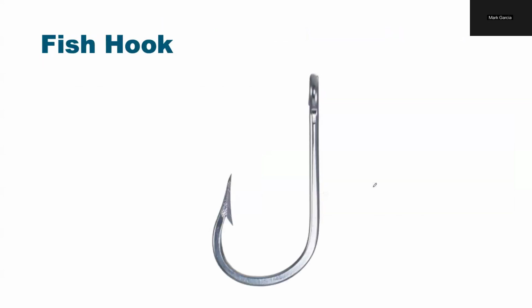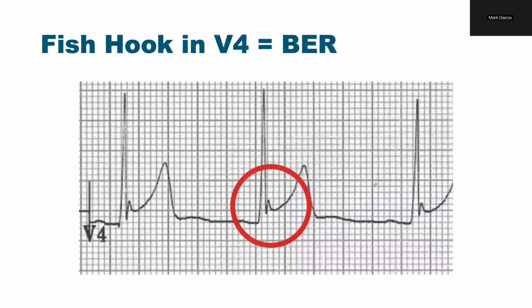All right. The other thing to look for is the fishhook, which we've talked about already in terms of the smiley face. So if you look specifically at V4, again, you see the notch and the smiley face kind of picture. And people say, oh, that looks like a fishhook. So if you look at V4, you're looking for a fishhook sign in benign early repolarization.